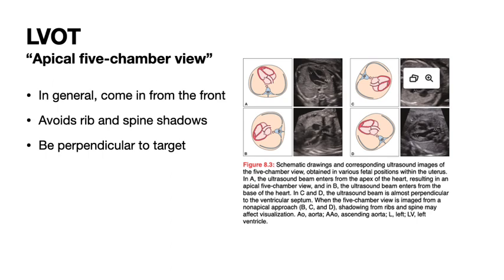So again, remember that when the beam is perpendicular to its target, that's when it's best. So if you're looking at the septo-aortic angle and looking for septo-aortic continuity, it'd be nice to come in perpendicular to that.